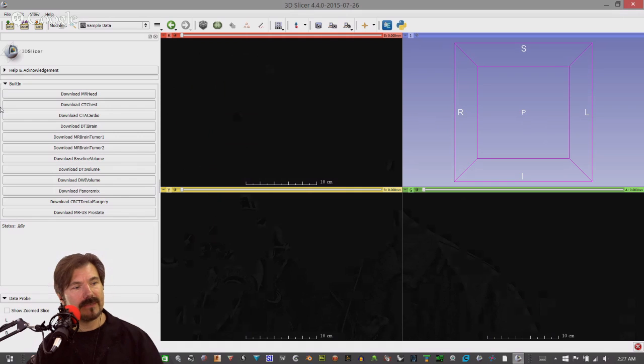One of the strengths of this application, and some of the others that are out there, is that it does use a GPU. So if you have a GPU-based computer, you'll actually see some benefits in the model creation, which means you can rotate things almost in real time, which is a strength. And you'll see that once we move into this, some of these models are fairly realistic.